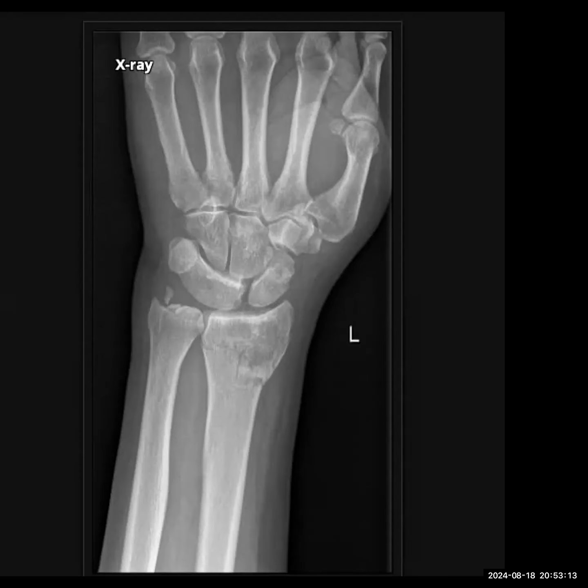Trying to look at other areas. I'm trying to look at the metacarpal joints. I'm suspecting a fracture involving the trapezium and dislocation. I'm not sure. I'll look at orthogonal views to confirm. Sure, I can give you an orthogonal view.